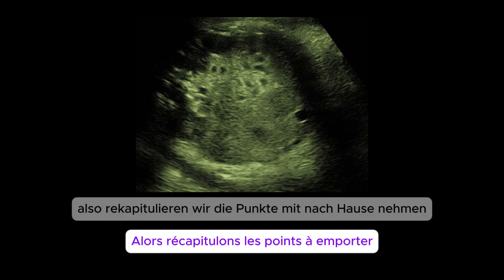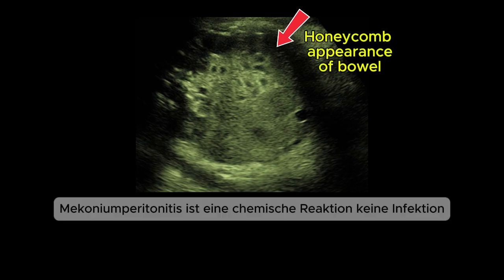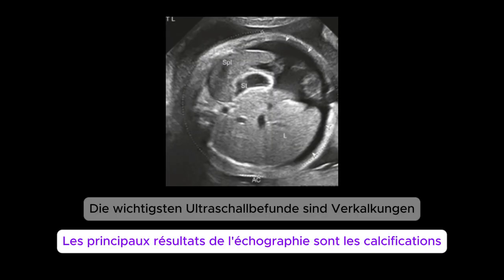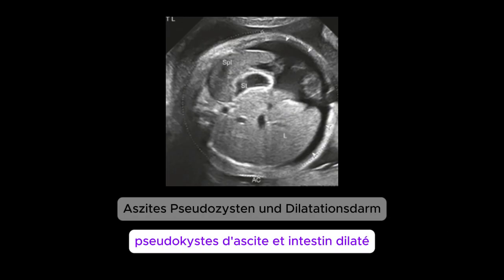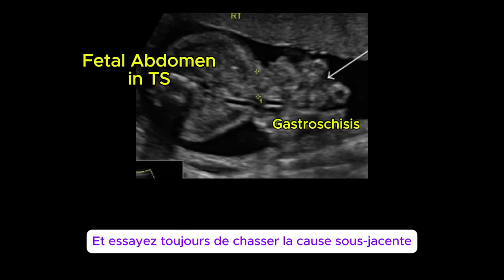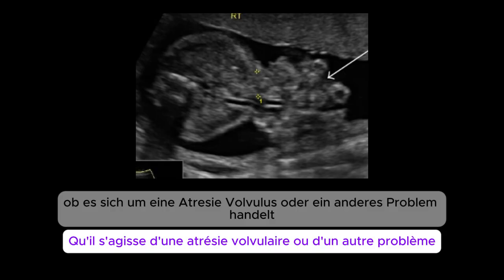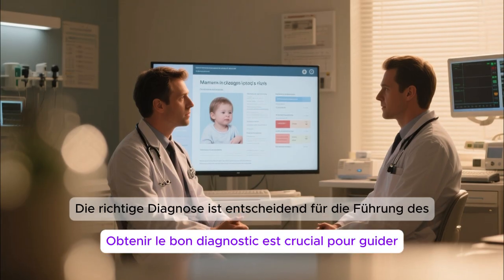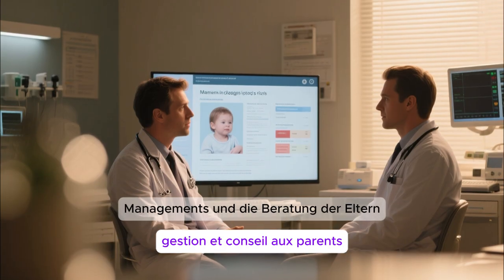So let's recap the take-home points. Meconium peritonitis is a chemical reaction, not an infection. The key ultrasound findings are calcifications, ascites, pseudocysts, and dilated bowel. And always try to hunt for the underlying cause, whether it's an atresia, volvulus, or another issue. Getting the diagnosis right is crucial for guiding management and counseling parents.